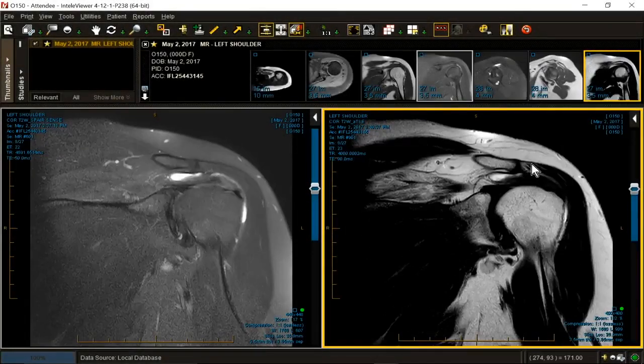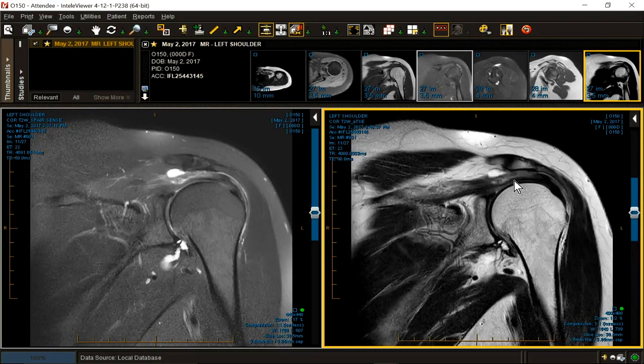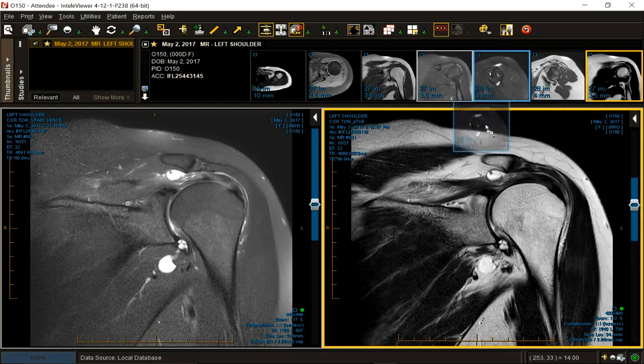Almost all T1s are the same unless different field strengths. By the way, T1, better at low field. T1 contrast is better at low field. But in Australia, that's a no-no, because low field is a bad thing. How's my T2 look? Quite good. It's not fat suppressed, but quite good. All right, let's go back to my water-weighted images.